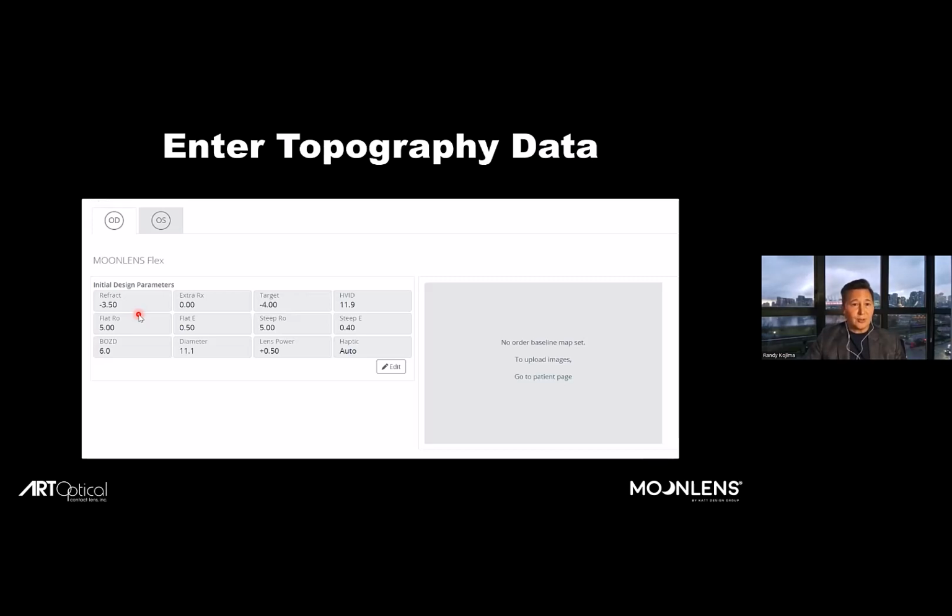It's purely the sphere. You'll notice that the therapy target is a half diopter stronger. It's -4 rather than -3.50. The idea, of course, is that we want to take the patient to +0.50 in the AM after removal of the lens, so by the end of the day, they're no worse than plano.